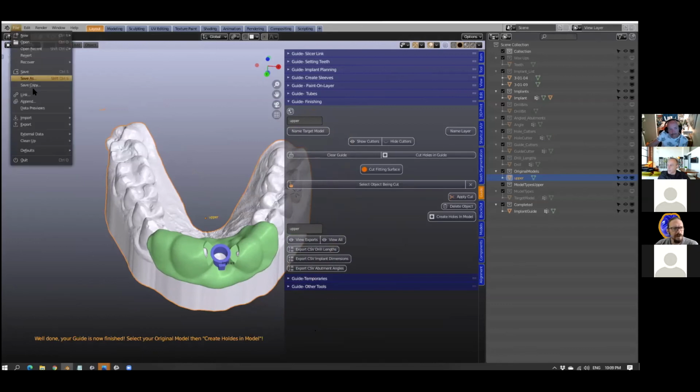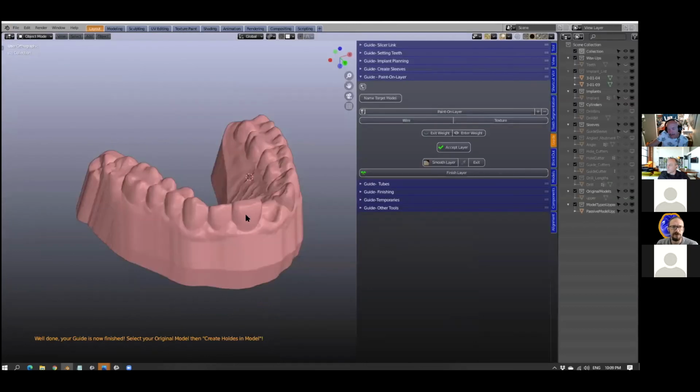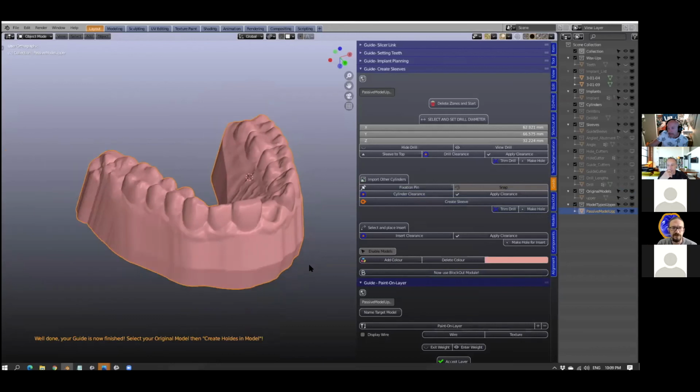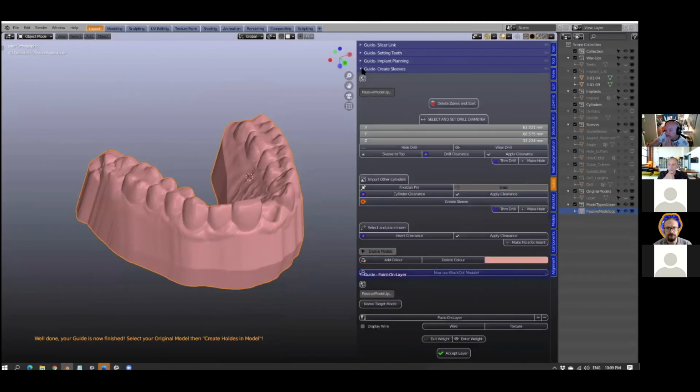Everything is fine. I was just looking for the question for when we use some housing with a laboratory analog with metallic parts. How much clearance do you put between the metallic part and the printing layer? Yeah, Michael, the offset, if you're using Steco components, is that what you're thinking? Maybe you can just do a quick demo with the skeleton, and perhaps you can put a Steco part into it. Yeah, okay.